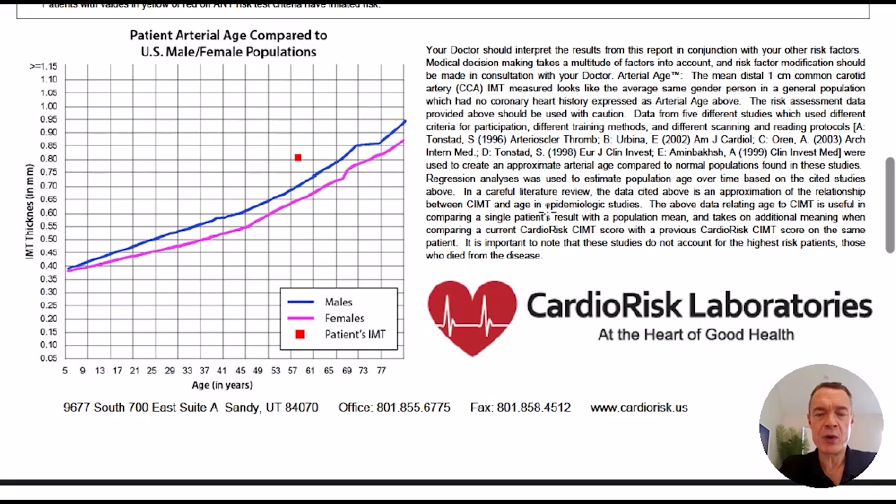So in sum, from what she's saying, Dr. Johnston, she was 0.54 millimeters recently at the age of 42, when she was 0.47 millimeters at the age of 40. So at the age of 42, as she herself indicated, she's right at the pink line here where I'm putting the mouse for her age. So she's quote unquote normal, but what she correctly noticed and is focusing on is something that I'm encouraging you to focus on, which is the trajectory.